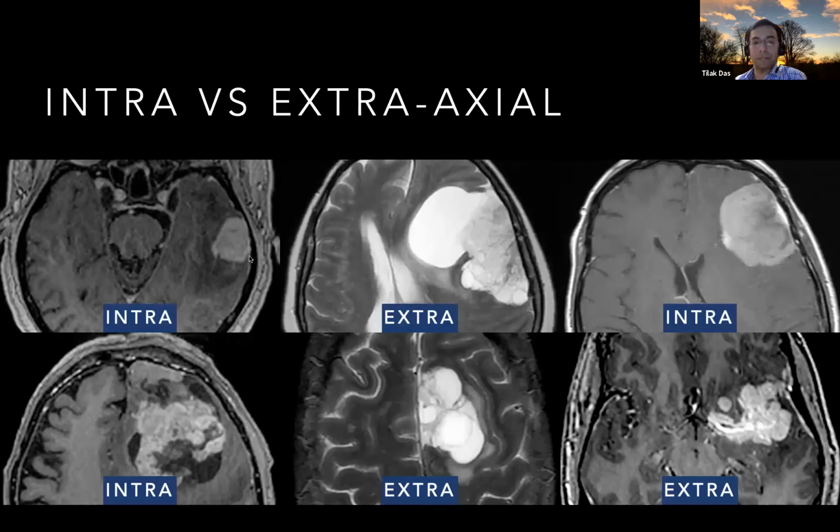This is a lymphoma, as it turns out. Pretty unusual. Case 2, much more classic. So huge, lots of cysts, multicystic, but there's clearly a collapse of the parenchyma here, and it's folded across with possibly a small cleft sign. So that's a bit more clearly extraaxial.